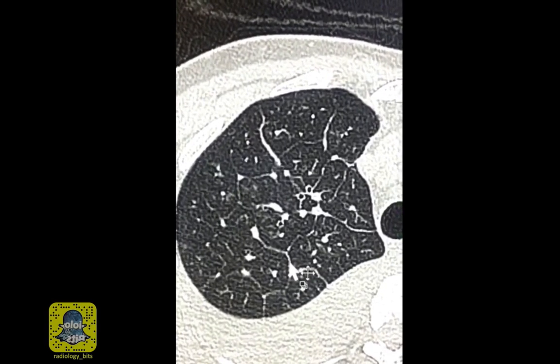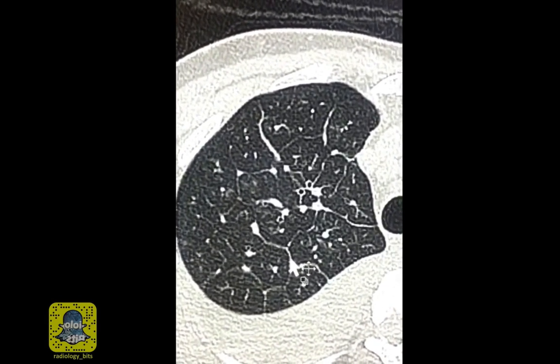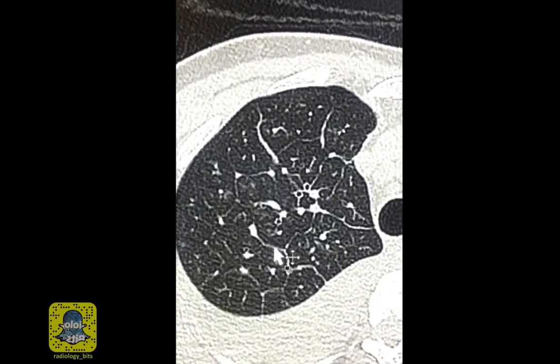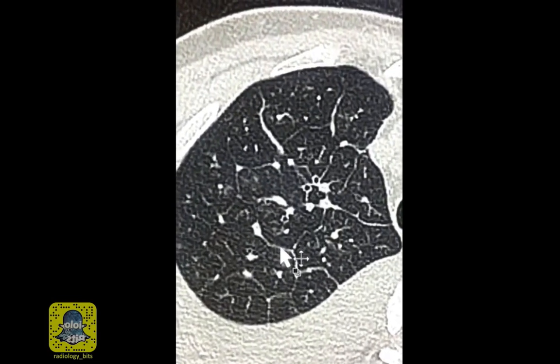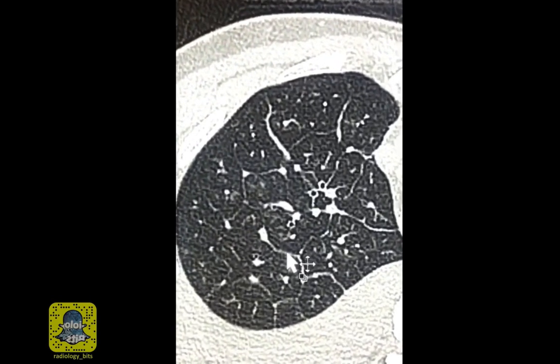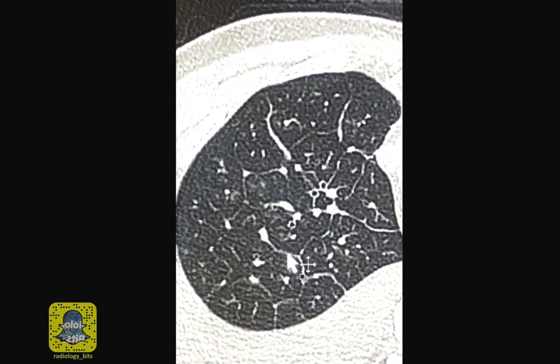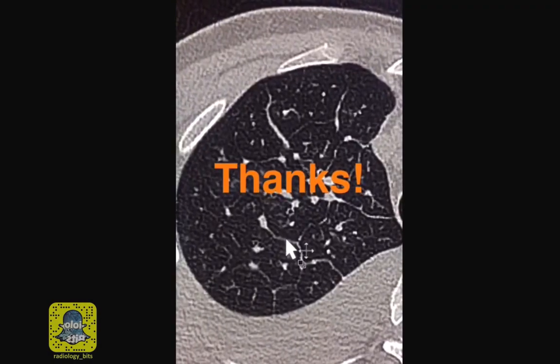The differential diagnosis of smooth interlobular septal thickening depends on whether it's acute or chronic. The differential diagnosis of acute septal thickening includes cardiogenic and non-cardiogenic pulmonary edema, atypical pneumonia, subacute hemorrhage, and eosinophilic pneumonia. That's it for today's case.